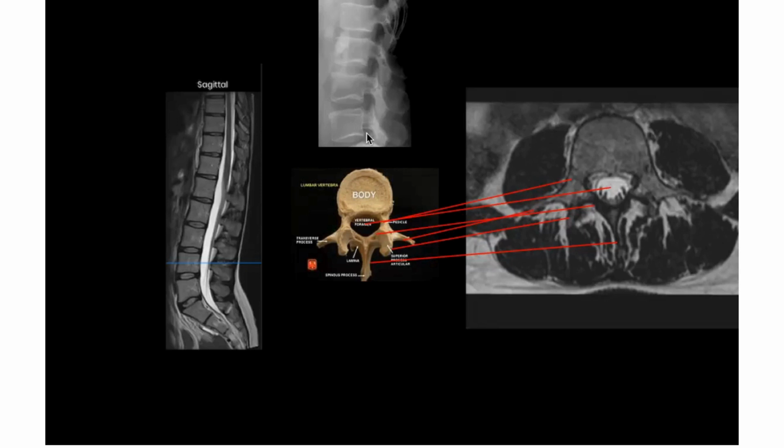Understood? Now this section is taken from where? This section is taken from here. That means this section is taken from this part. How can you say that this section is taken from this part? And why not this part?